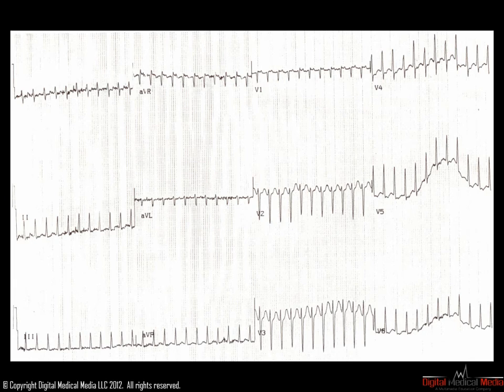Here is a 12-lead ECG showing a very rapid SVT. The R to R intervals are extremely regular, and the rate here is approximately 250 beats per minute. When we look for P-wave activity, it is apparent, particularly here in lead V1, that there is a deformation not consistent with a normal T wave. This bump is in fact atrial activity and is the P wave.